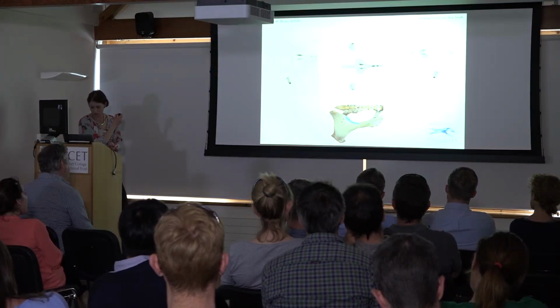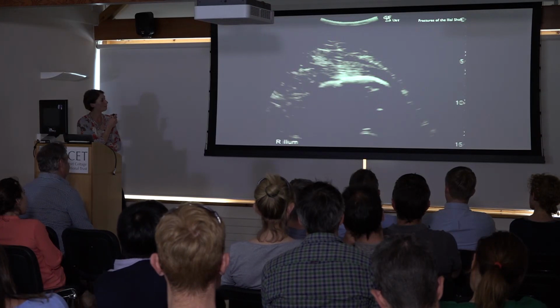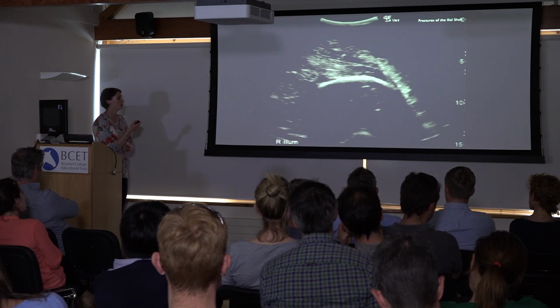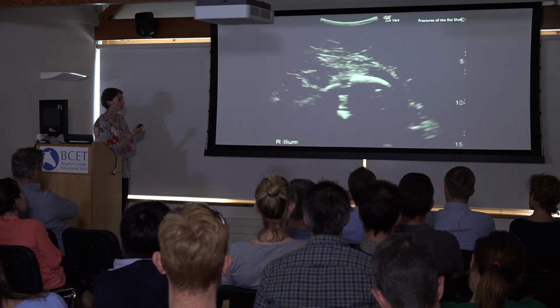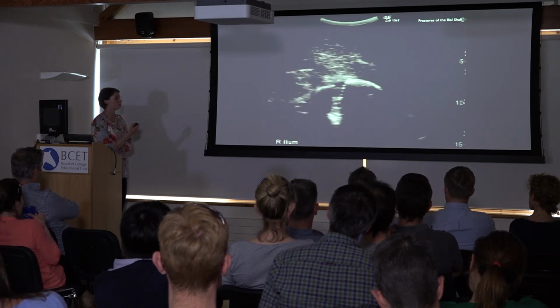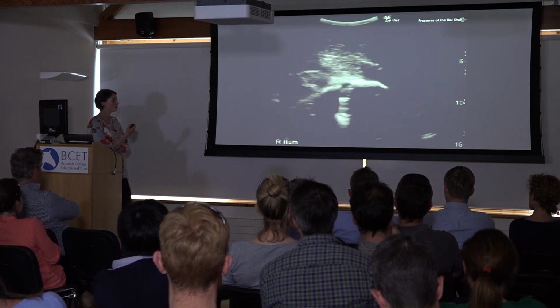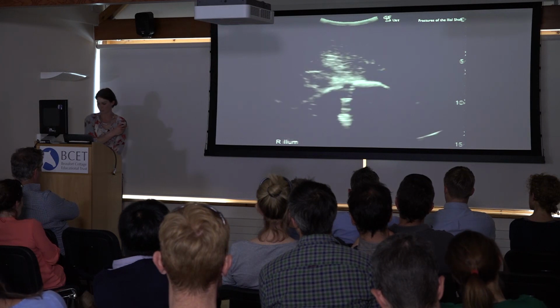So as I said, these cases are more significant. They do require cross-tying, and they will be much lamer, undergo much more severe muscle atrophy compared to our routine, our sort of more normal, typical ilial wing fractures.